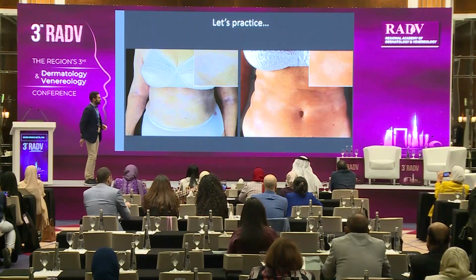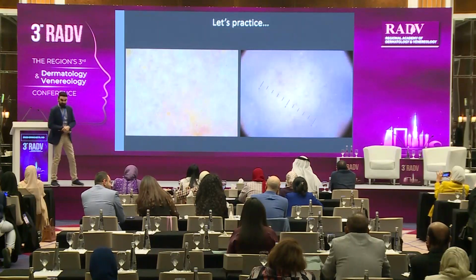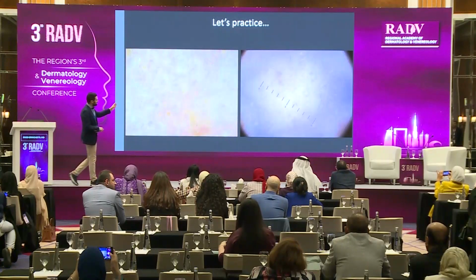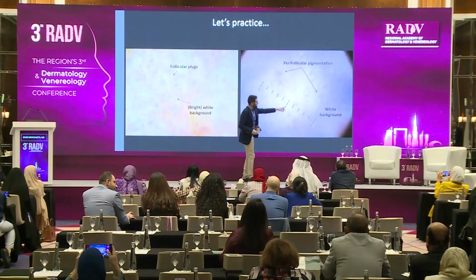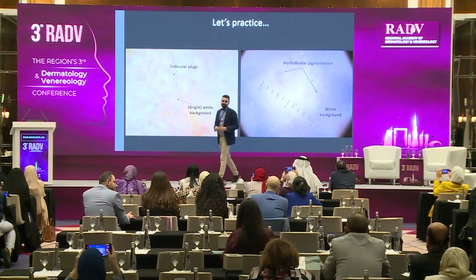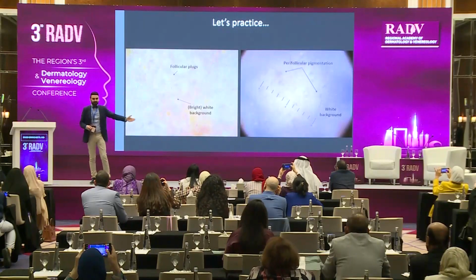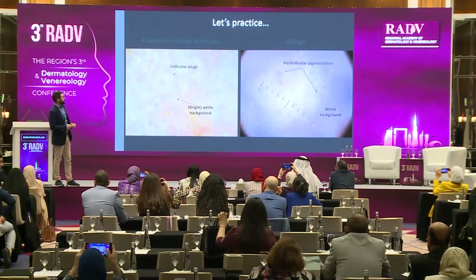Morphea. Okay. So, this one, and this one? We have perifollicular pigmentation, vitiligo. And here we have follicular plugs. So, you're right, this is lichen sclerosus, and that one is vitiligo.